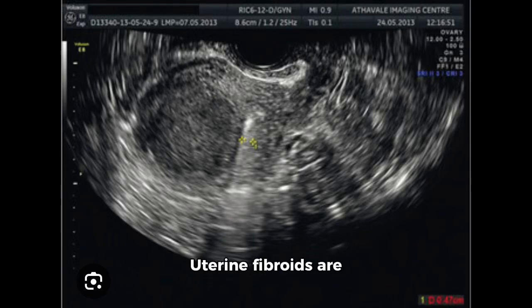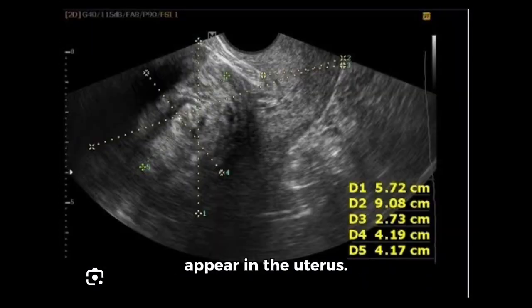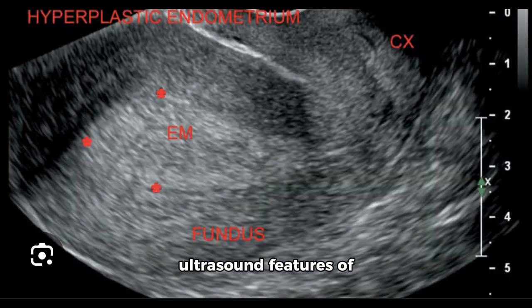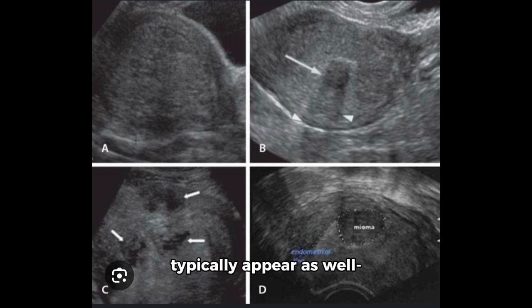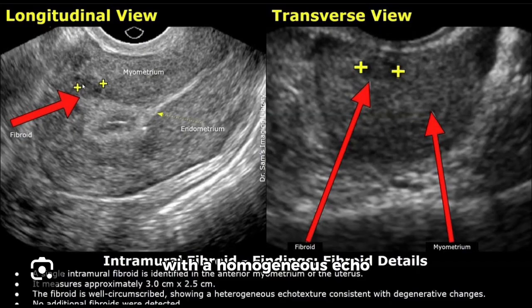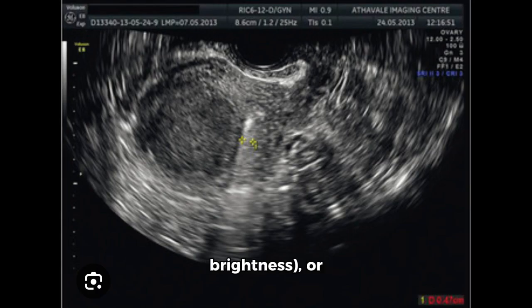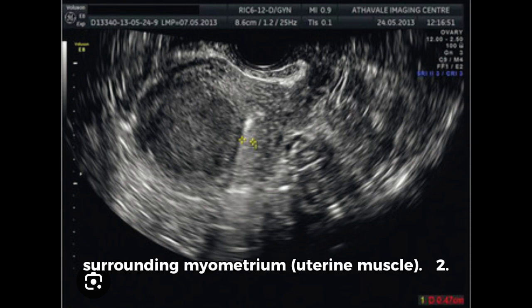Uterine fibroids are non-cancerous growths that appear in the uterus. Here are some common ultrasound features of uterine fibroids. 1. Echotexture: fibroids typically appear as well-defined, solid masses with a homogeneous echotexture, which may be hyperechoic (brighter), isoechoic (same brightness), or hypoechoic (darker) compared to the surrounding myometrium (uterine muscle).